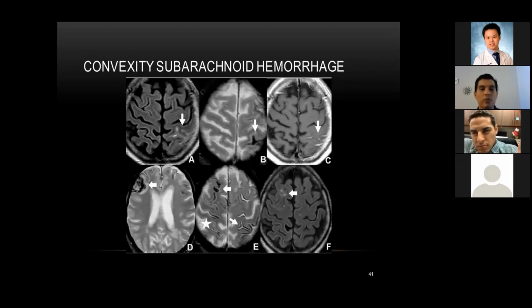Two years later, this patient has this ICH and this deposit of hemosiderin in gradient, and it is bilateral. This is the original lesion, and this was in an asymptomatic patient seen between both episodes. In this case, this patient has only episodes of right hand paresthesia, recurrent episodes of right hand paresthesia.